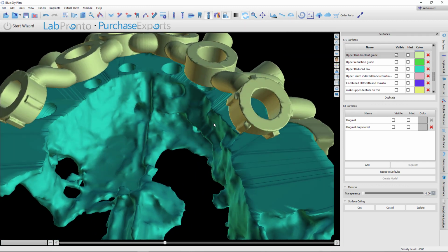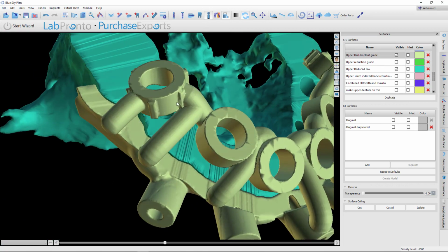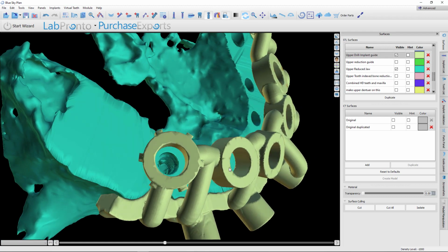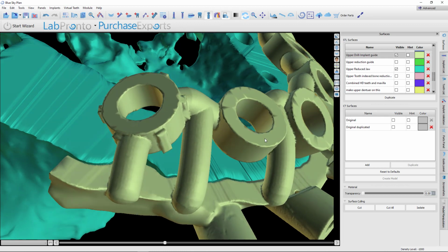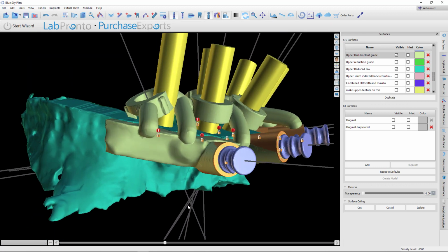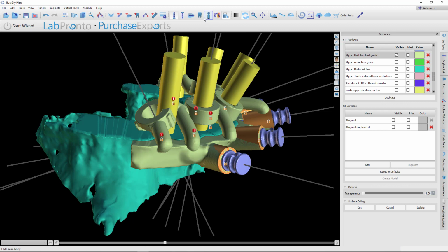And something to notice on the disto-angulated ones, you've got timing marks. And every one of those little timing marks corresponds to a flat inside the hex of the implant. This is for Biomax implants. So if we want to have everything line up, then we've got to make sure the implant not only ends up in the same position, but also the same degree of rotation so that that multi can sit in there and correct to the same position where we had it. If you remember, this is where that angled multi is going to correct to. So if I have it in the right position, but the timing is, say, 30 degrees off, then this yellow tube is not going to end up in the right position where it needs to.